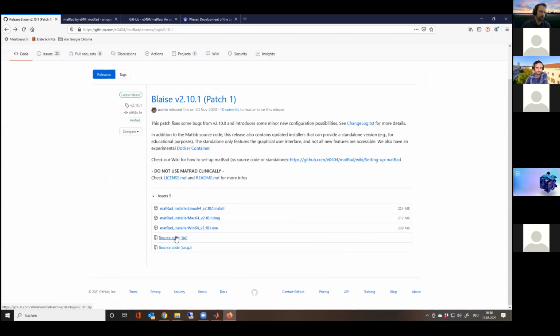You can also already download the code and put it into some folder. I think it takes a while to download. We also have this DMG installer for Mac. Hans-Peter can show later how this works. First, I will show the Windows installation, and basically the installation is the same on Mac. He's a Mac user, I'm a Windows user. Yeah, so maybe you can show it on both systems. Exactly. There are just one or two pitfalls that I would like to make you aware of.